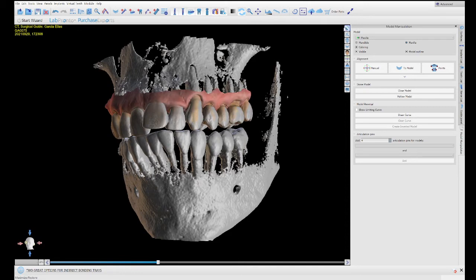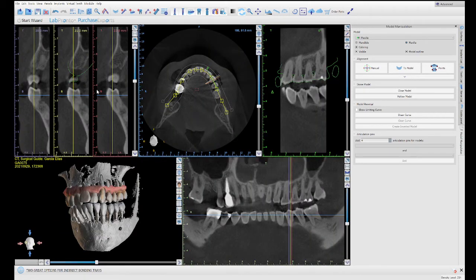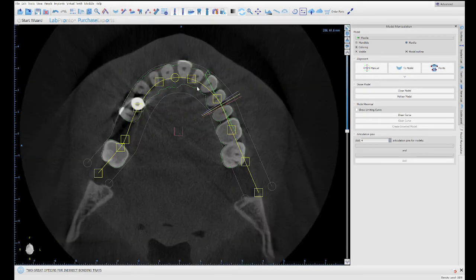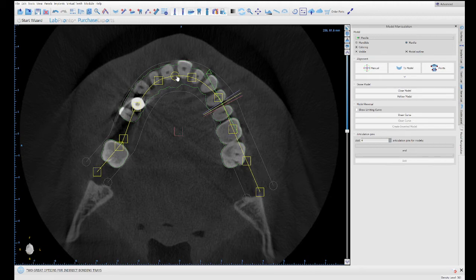Now, how do we verify that? We go to the upper left side on this sagittal cut over here. First, I'm going to go back and center, and make sure that my coordinates and my points are centered exactly where I want them. You want to put it right in the middle of the crest or the fossas in this case, and you can click and drag these squares to set whatever views you want to see or what the field of view is going to be.